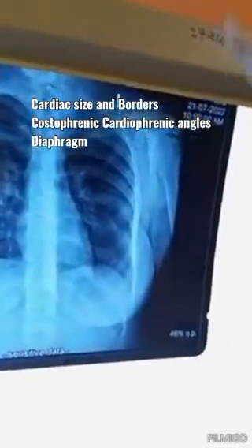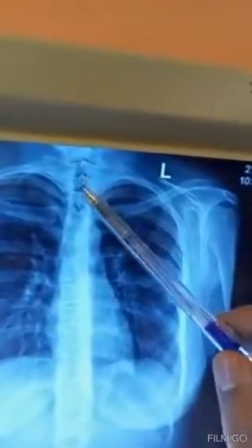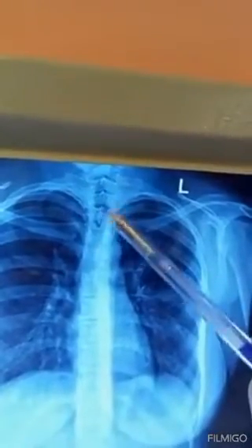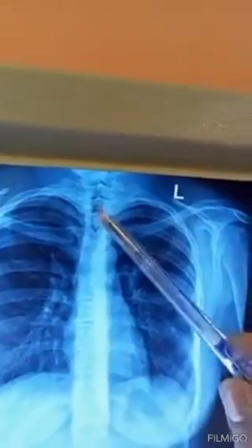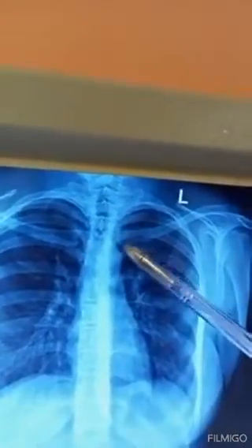So far we have read three things. Airway. So this is the trachea. The trachea is mildly to the right on the vertebral column, and it is normal when it is mildly to the right, because the lung mass on the right side is more, so it has pulled it a bit more to itself, as compared to the left one, right?